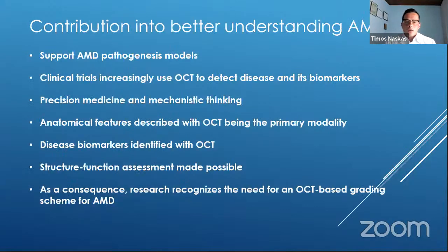So again, we can use OCT as a clinical biopsy. Several pathogenesis models of AMD which have been built so far can be described better, supported, or changed as needed. OCT has also contributed to detecting disease biomarkers earlier, and more clinical trials use it as their primary imaging modality. And we can also use OCT to apply precision medicine to our patients.